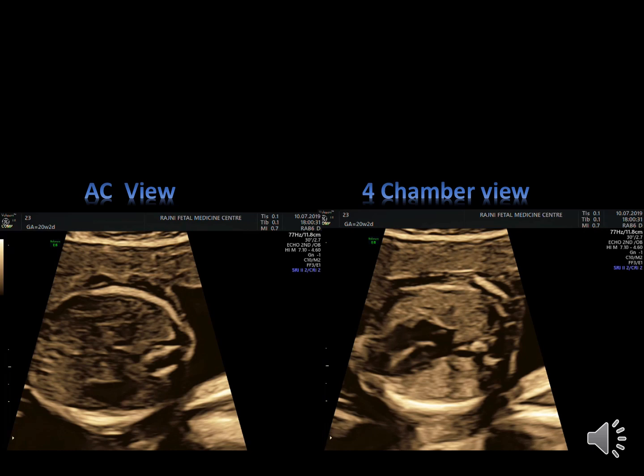Normally the axis is normal in cases of tetralogy of Fallot, but there can be axis deviation in some cases, if it is associated with complexity or inequality of the chambers. Usually the aorta is situated a little to the left, but in a few cases of tetralogy of Fallot, one can identify the aorta situated just in the midline or a little bit to the right side of the spine.